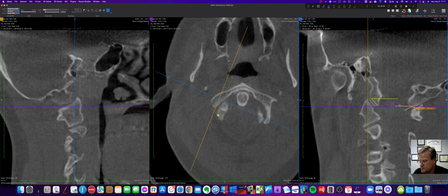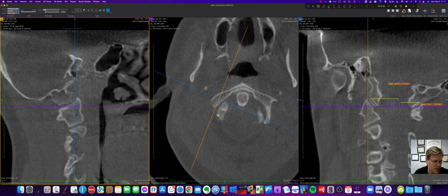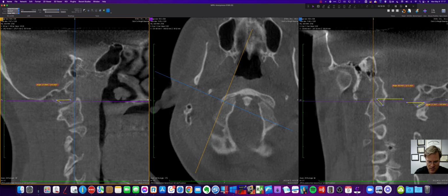Let's measure that. Get rid of that. Boom, boom. All right, shift, bring that back in. Let's take a look. Posterior 1/3 of that compared to the ground. 27. Now, 27, I don't remember what the other one was, but we can look later. Let's go ahead and get the axis back in there. Let's take a picture. So that's the left side.